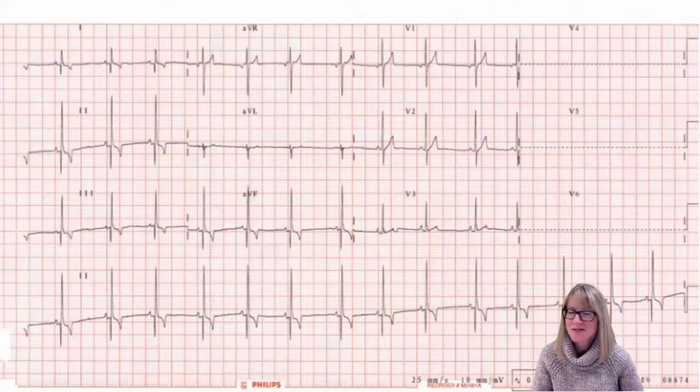Welcome to another episode, and today we're going to talk about heart rate. We're going to review a couple ways to do that. We're going to talk about sort of an average heart rate, and we're going to talk about instantaneous heart rate.